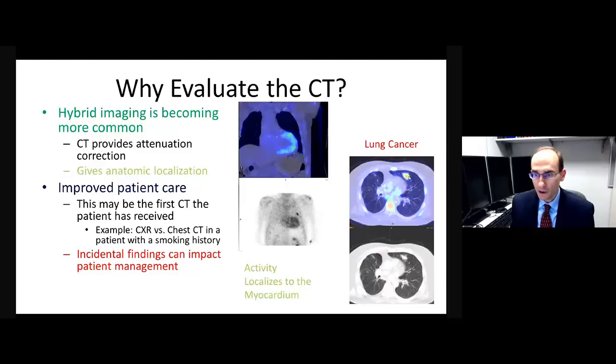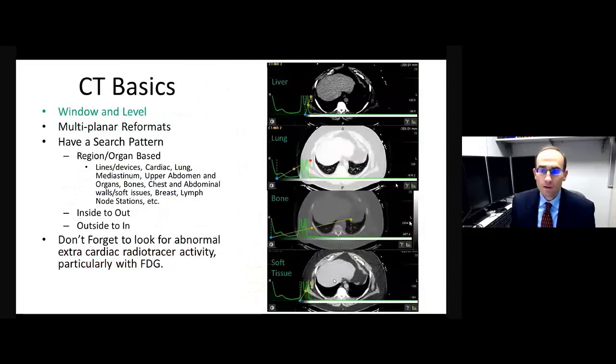And in this case, you find this incidental pulmonary nodule or mass, and it takes up FDG. You've just made a diagnosis of lung cancer in this patient and affected their management. So when we start talking about CT, I think we need to review a few basics here.